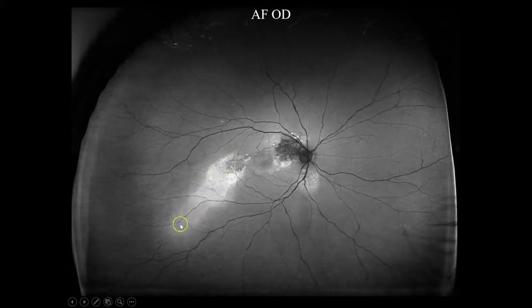This was fluid at one point, still could be fluid. And you can see that the retinal pigment epithelium is sick. It's hyper-autofluorescent, so you have sick tissue. We have some dead tissue over here, if you will, and this would correspond to an enlarged blind spot. Some lesions over here. And that's pretty dramatic.